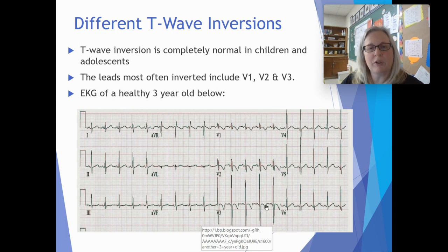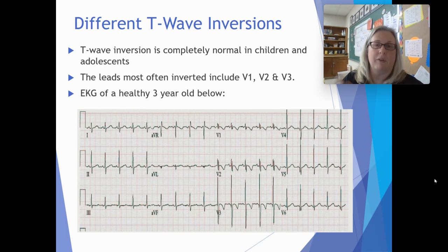So V3 will flip over first, then V2, then V1, and occasionally V1 never flips over. Not a big deal if it's non-diagnostic, right? So just be aware of that.